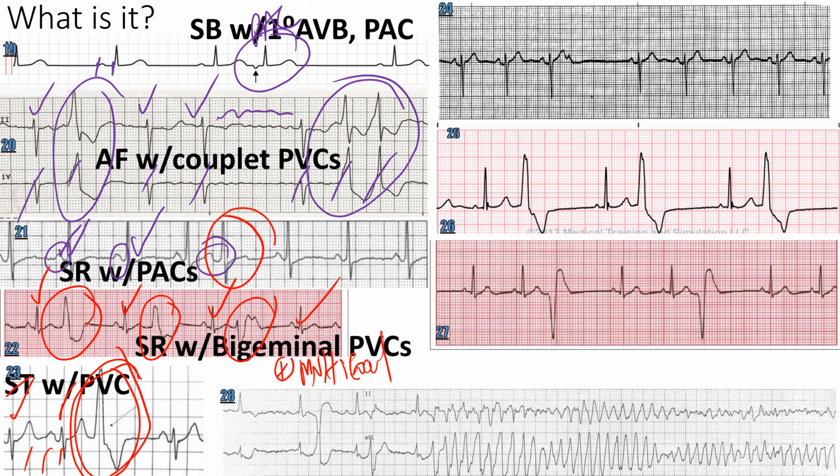Okay, and over here we got, is that a dropped beat? Let's see what's going on. We got P wave, QRS, P wave, QRS, P wave, QRS, and this actually might be a block thrown in here. This might be an error, because that's unexpected. That P wave actually didn't get conducted. It's an early PAC, but it didn't get conducted because they might have an AV block of some sort. So that's a little bit tricky. I would not do that to you. Okay, that PAC is missing in action, MIA. That's supposed to say MIA.